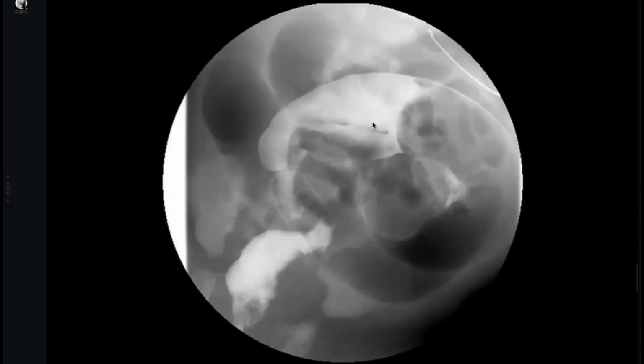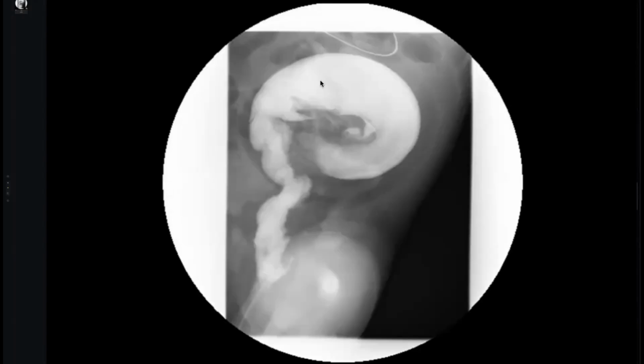Second, you must stop here, here, here, at the slice of importance and start to describe in short bullets containing a buzzword. If you tell the examiner, doctor, there is reversal of the ratio, the diameter of the rectum is smaller than the colon, and there is a segmental narrowed collapsed segment with reduced diameter.